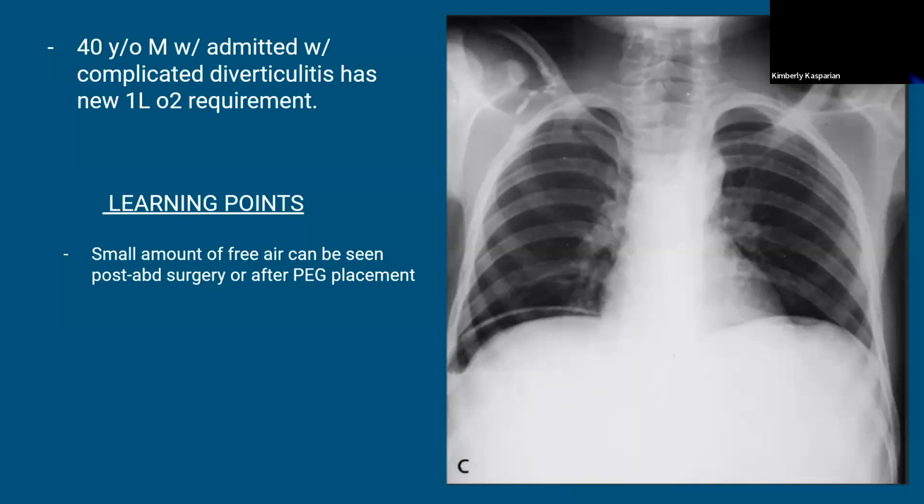So, questions, concerns? How come you don't see it on the left side? Is it just mostly because you're working on the right? Yeah, it's probably that. This is just one of the first Google images I pulled up. But a lot of times you will see it unilaterally, especially if the patient is laid on their right side or left side, the air will move to the top portion.